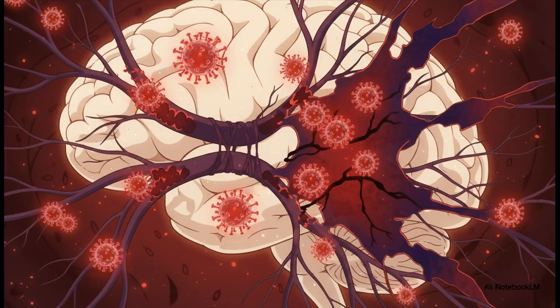So what you'll see is high T2 signal out in the white matter from all that ischemic damage. Okay, listen up, because this is a really crucial point about neonatal herpes. This is almost always HSV2, and you need to take everything you learned about adult HSV1 and just throw it out the window. Seriously. In adults, it hits the temporal lobes, the limbic system, but in a newborn, the virus goes after the endothelial cells in the blood vessels. This leads to thrombosis, and you get these absolutely devastating hemorrhagic infarcts. We're talking widespread brain destruction, encephalomalacia. It is a totally different disease.